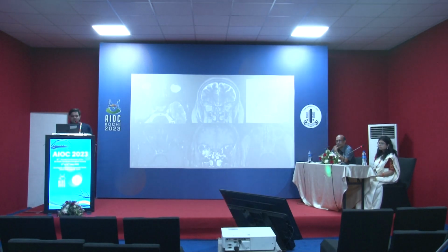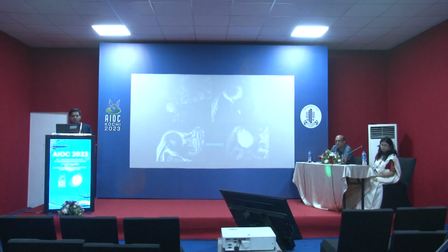Because we want to see this finding of a focus of enhancement in the starting phase, which fills the whole tumor by the time you finish imaging it. And this is pathognomonic of a cavernous hemangioma, which according to the current ISSVA classification is a venous malformation. So these are cavernous hemangiomas. The previous one was just a hemangioma. This finding of a point enhancement extending to the whole lesion is what we are looking for. So you should advise your radiologist, if you have a clinical suspicion of a cavernous hemangioma, to do a dynamic contrast.